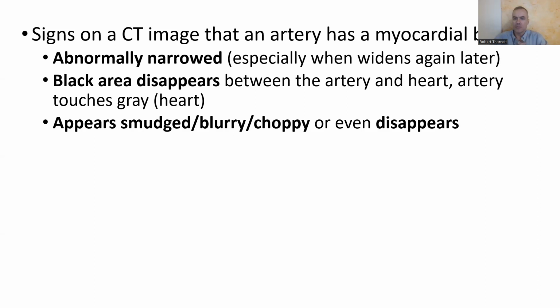So that's a look at how to spot your myocardial bridge on a CT image. They're all a little bit different. So you want to apply these ideas generally as you find them on your CT.